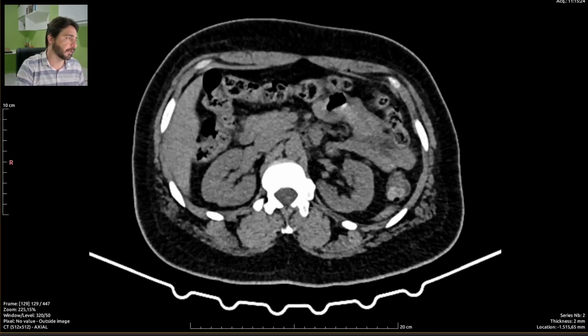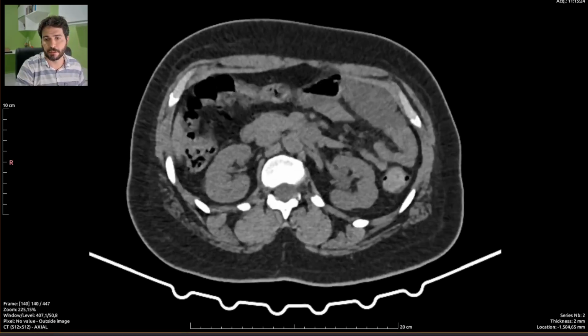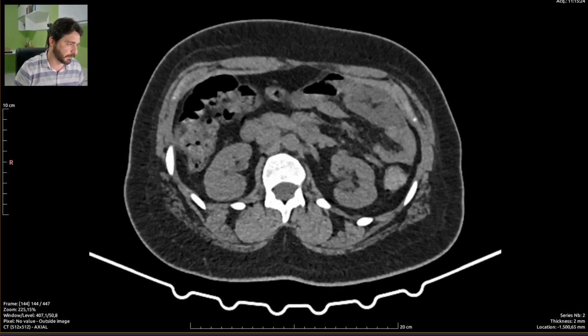So, yep, let's go. Let me get my template for a young female abdominal scan. Unenhanced. No gallbladder. No kidney stones nor hydronephrosis, but there are some tiny, probably cystic lesions on the left kidney sinus.